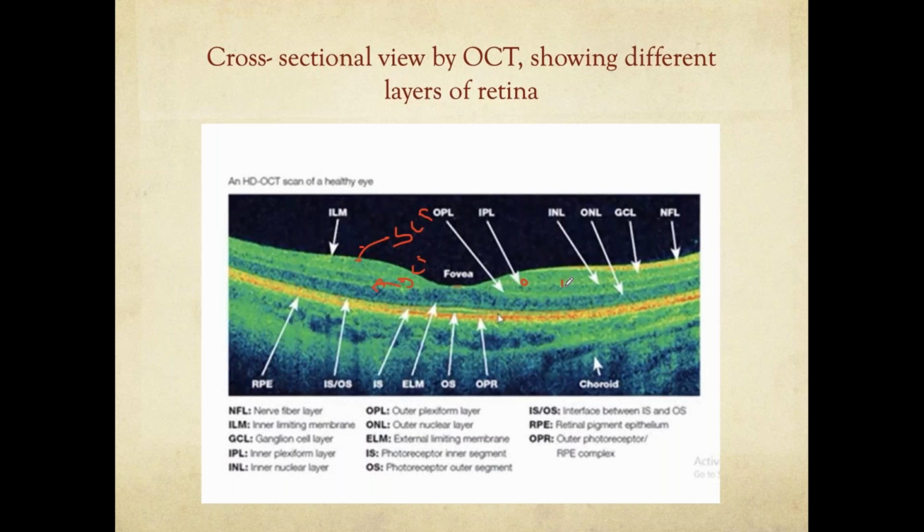If there are just a few of these lesions separating the plexiform layers or the wires, there are still a huge number of wires connecting the outer retina to the inner retina. So most of the signals are still being transferred. If only this amount of area is split, there is still a chance of a very good prognosis.